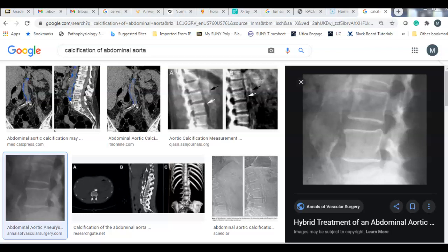I caught part of the aorta and I could see this calcification. Actually, I do think it was expansile on him. It's above 4 centimeters, was the guideline. If they start to get above 4 centimeters, that is indicative of surgical intervention, depending, of course, on the patient, because it is, as you know, pretty invasive surgery. Anyway, he came in and he did indeed have that abdominal calcification with expansile lesion.